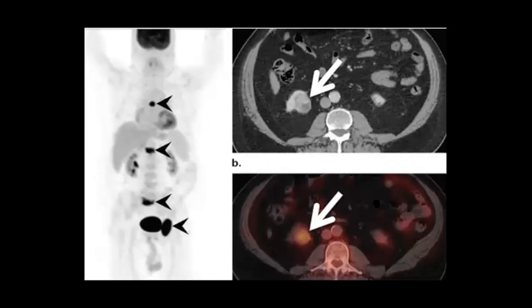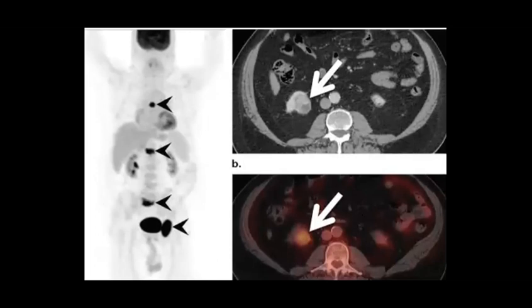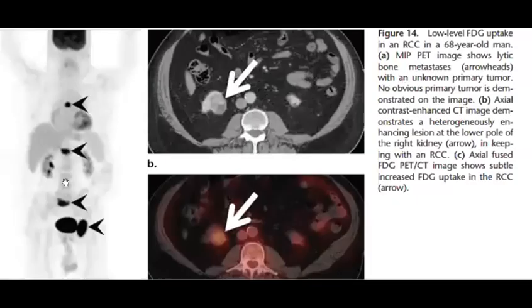So okay, this one, I will show you the answer to read a bit: it came with these lesions, bone metastasis, and he was unknown primary. Then when he did the FDG PET-CT, they found this lesion, which, if you compare it with the others, doesn't have this high uptake.